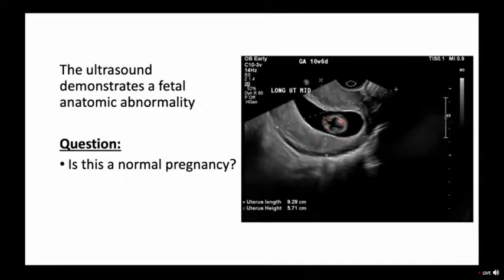Transverse section of the head. Typically, I think you might see something different. What do you guys think about that? Come on off mute, guys, or type in the chat box. It looks like some anatomy is missing or fluid. Yeah, the fluid in kind of the central portion of the head. Right off the bat, I don't see a midline falx. Right, ideally, maybe it is definitely missing. Definitely interesting.